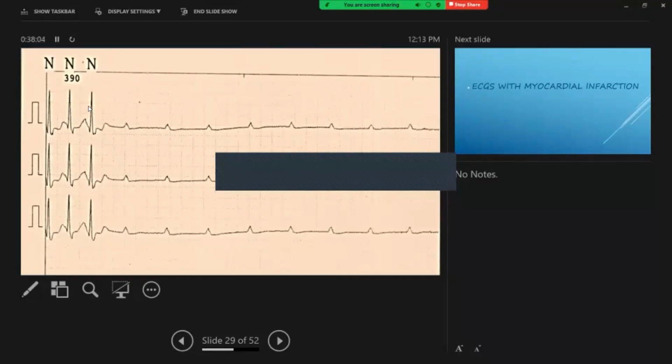Now this slide, at the beginning, you can see tachycardia with broad QRS complexes, followed by only P waves on the baseline. So there is no ventricular contraction, only atrial contraction is there. So this is called ventricular standstill. This rhythm can complicate complete heart block. Patients with complete heart block and broad QRS complexes can end up in this. And trifascicular block. You know what is trifascicular block? Right bundle branch block with axis abnormality plus prolonged PR interval. Those patients are at high risk of developing this rhythm. So this is ventricular standstill. Ventricle does not contract.